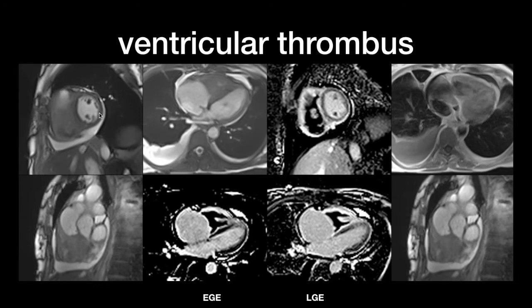Large acute right ventricular thrombus can also be seen in acute pulmonary embolism or cases of endomyocardial fibrosis, where an arrow-shaped enhancement along the endomyocardium can differentiate it from the other condition. This was a case of acute thromboembolic phenomena.